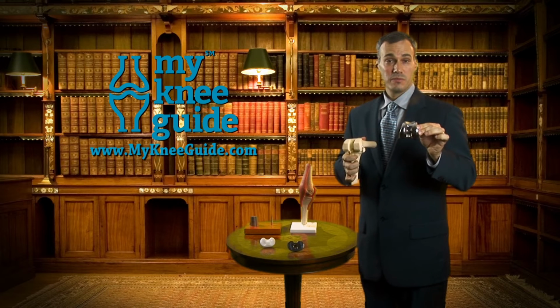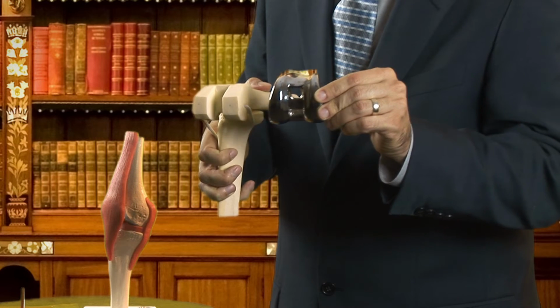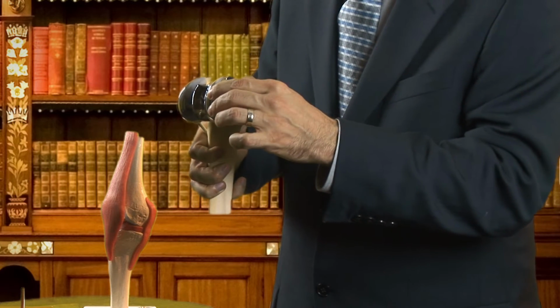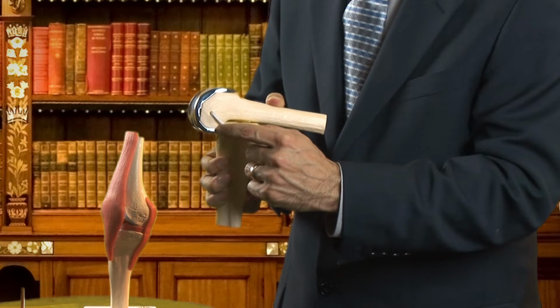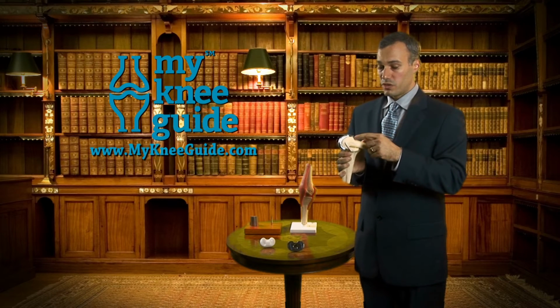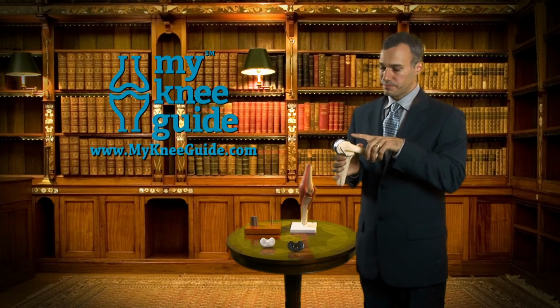Now, this prosthesis comes in different sizes that are available to your surgeon during the operation to fit your particular anatomy. So let's apply the new metal prosthesis on the end of the thigh bone. You can see we have a very nice fit. Typically, this will be cemented into place with a special cement called methyl methacrylate.